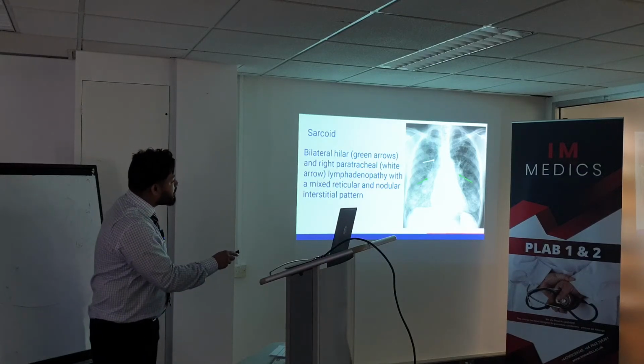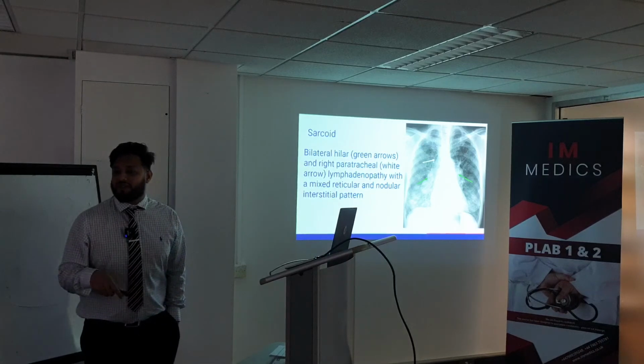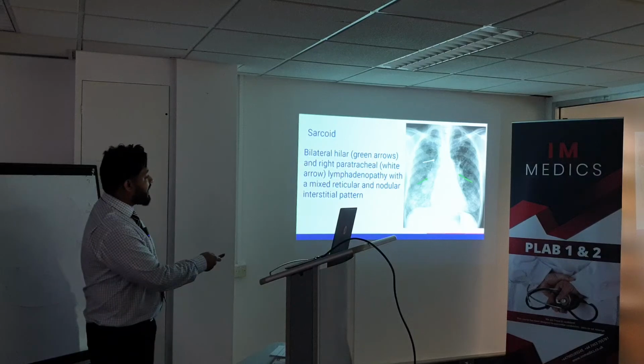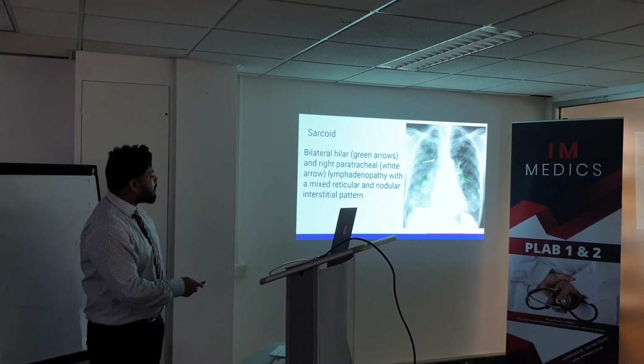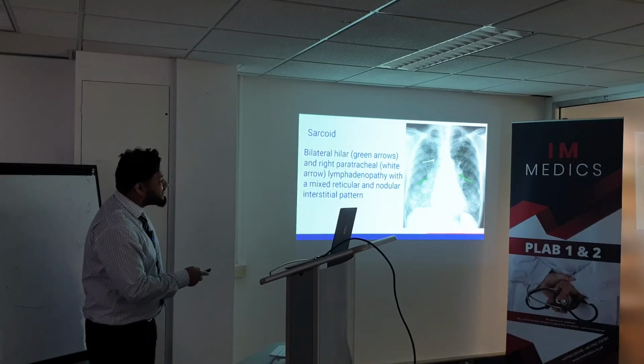So they will literally give you this and say, what is it? And they might give you a few diagnoses in the history and everything else, and we think of sarcoidosis. Remember I told you in x-ray, bilateral lymphadenopathy, and there you go, bilateral. But this one, normal person, they might also think, oh, it is everywhere, isn't it? It looks everywhere, but it's more dense. Can you see the color?